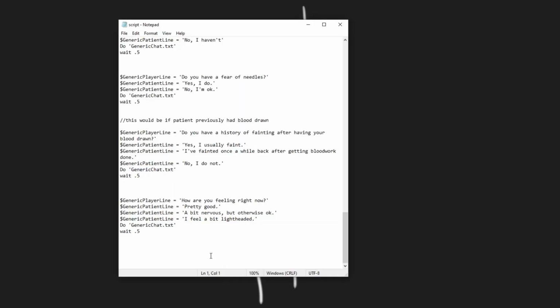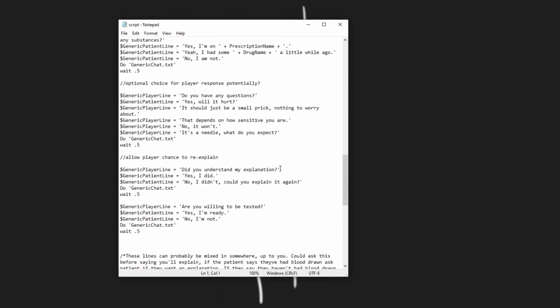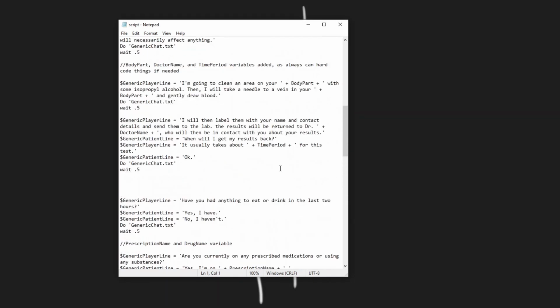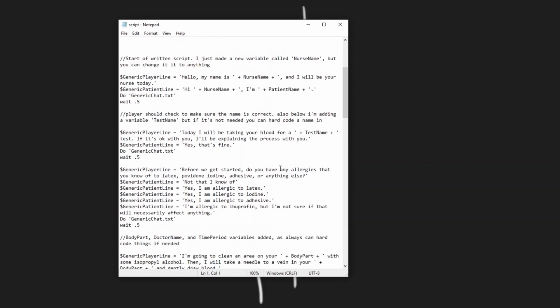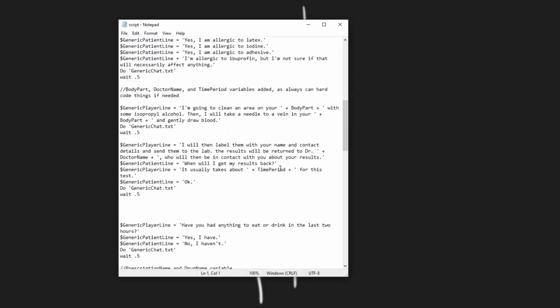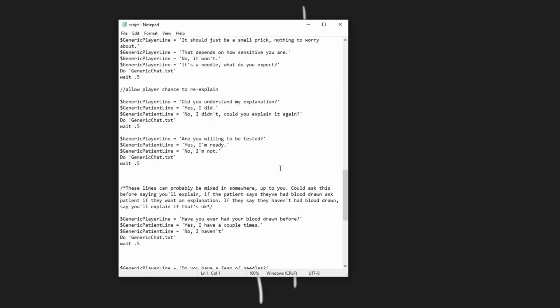It's white so that the color can be changed in editor to better match what color a vein would look like on certain skin tones. And also here is some of the simple code that I put lines into so that it can be implemented into the simulation itself.